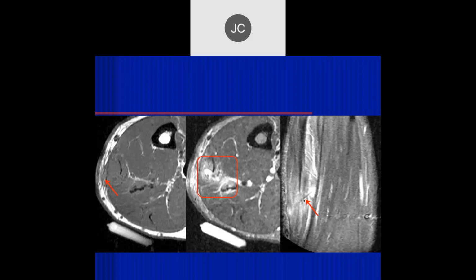And what do we see here? Is that a needle? That's a thorn. Is it a thorn? So this person was an avid gardener. This was actually many years ago in Santa Barbara. In the fall, we get the Santa Ana winds here, so you can get fronds from palm trees all over the place. And they have these long stickers about 4 inches long. If you're not careful, they can end up here. And that's what it was here.